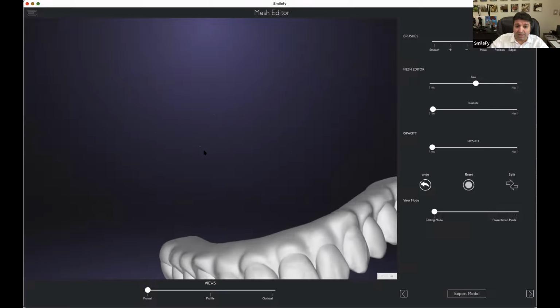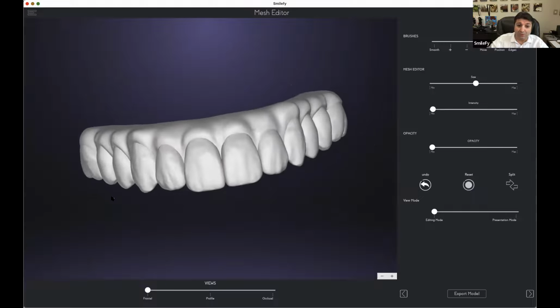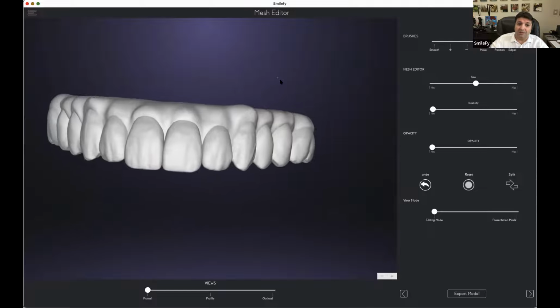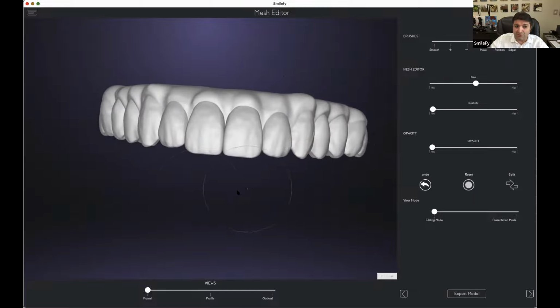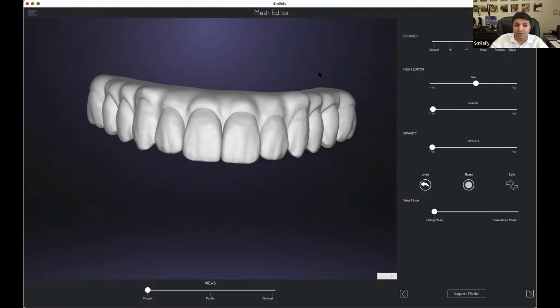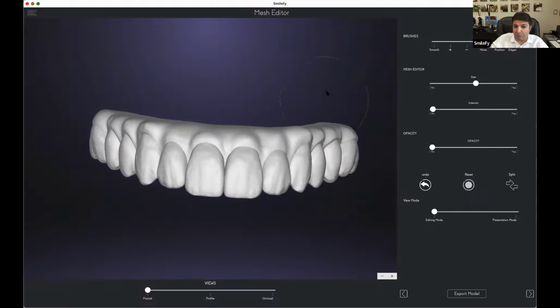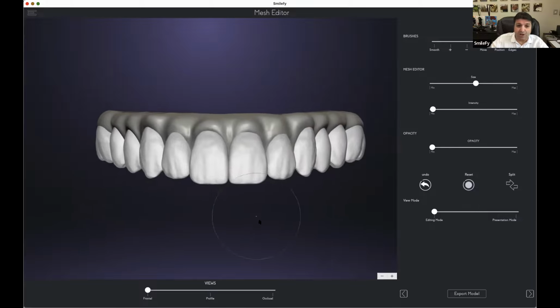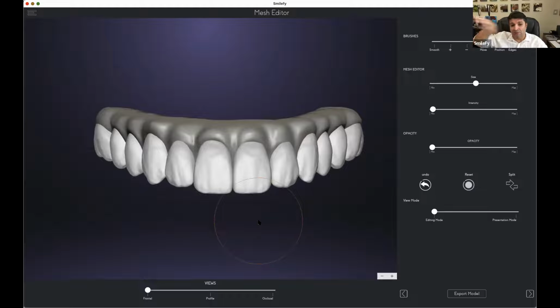But of course, with the CAD operations that we have, we're going to be able to use the implant bodies and create the holes, to create the position of the implants here in the full bridge. So that's going to be part of the workflow, and that's going to finalize what we do. And then you can print.